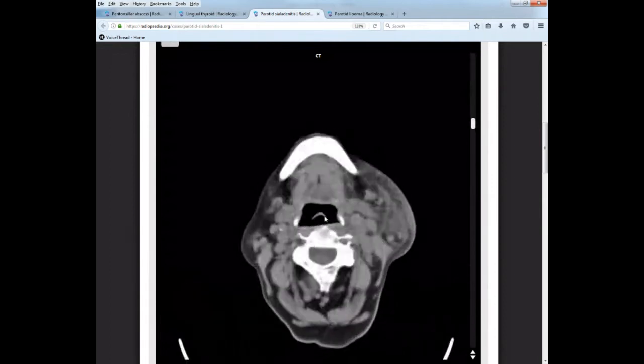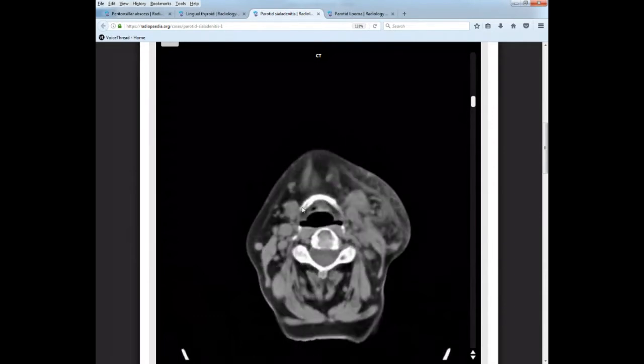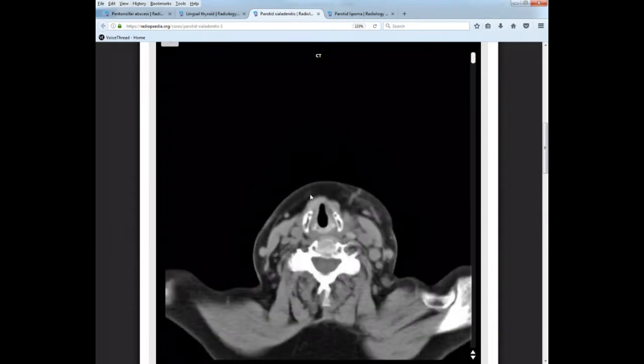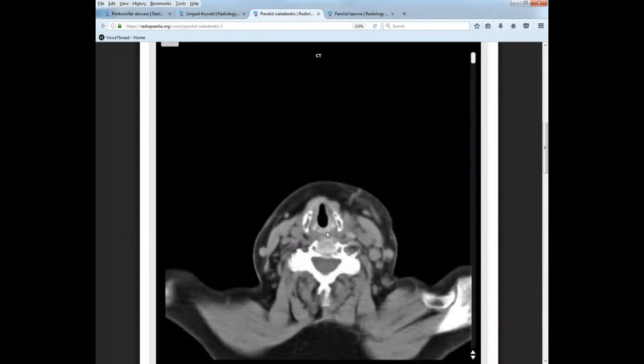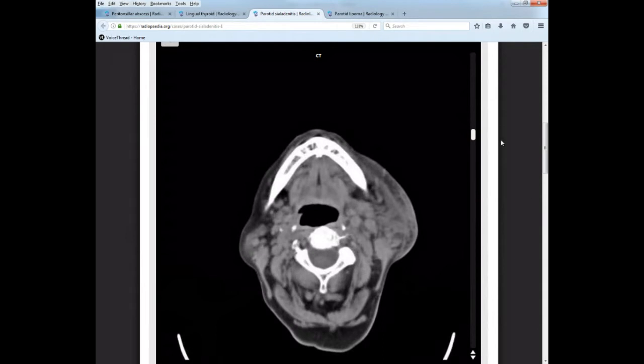So as we're coming down, the level of hyoid, which is right here, we now have exited the oropharynx and we're entering the laryngopharynx. And then the laryngopharynx is going to travel down to the opening of the larynx and the esophagus, which remember, esophagus is behind trachea, so it's back here, but this doesn't go down low enough for us to see. Okay, and that's that in axial view.